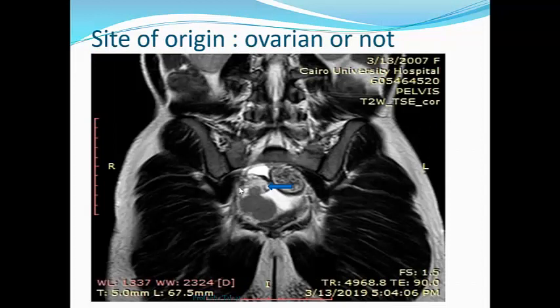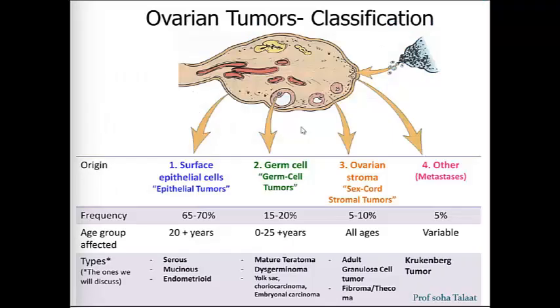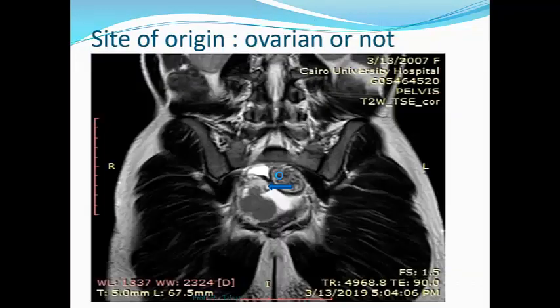Another case. This is the ovary, this is the ovarian stroma, and these are the antral follicles present in the ovary. We stated before what the antral follicles are. They are in the background of the ovary, less than 10 millimeters each. And then there is this mass arising from one of the follicles. It is a germ cell tumor. If we return to the figure seen before, here it is arising from the follicle. So this one is a germ cell tumor.